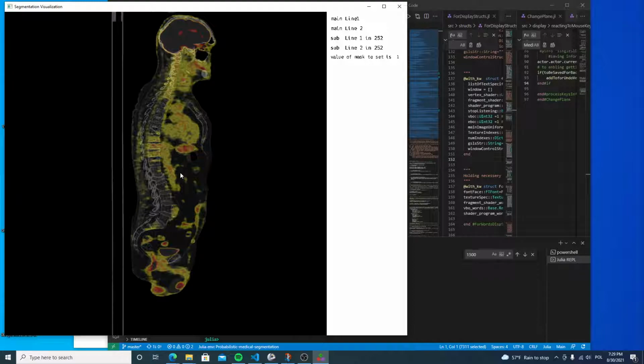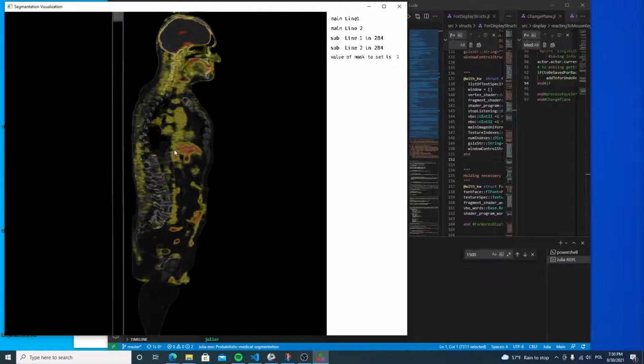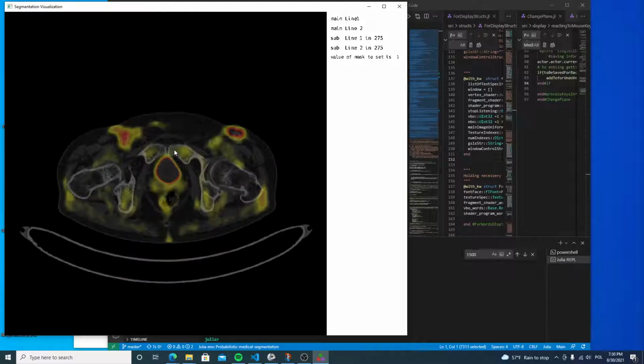Of course, how it would display depends mainly on what data would be uploaded, because this just depends on how dimensions were permuted or not permuted in case of the dataset. As was also explained in the README, in case of Julia we have this column-wise contiguous memory, so we need to do some permutations of dimensions in order to display it properly, as you can see here. Okay, so let's maybe get back here.